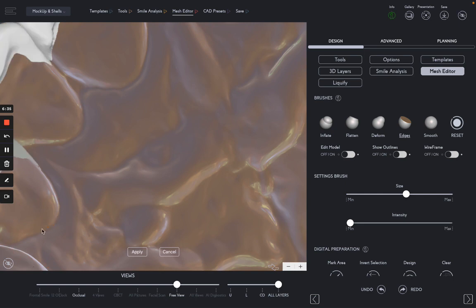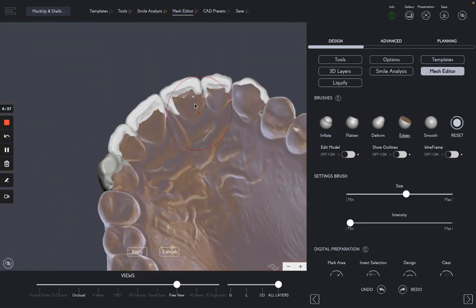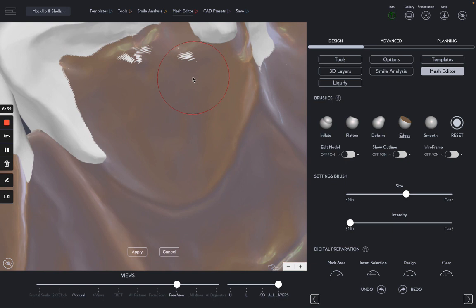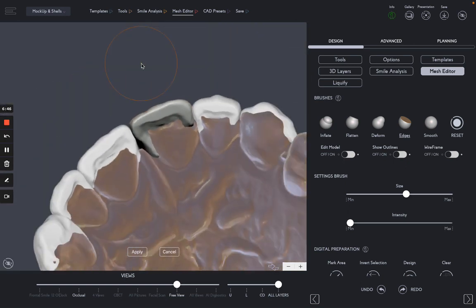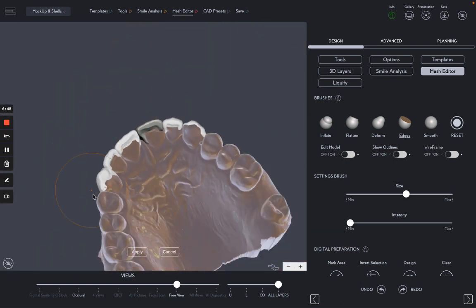All right, so now that it's nice and clean, actually there's a little bit here as well. Let me select the tooth first, and now, okay. All right, so now that it's nice and clean, you will hit apply, okay? This button is right over here. If you don't hit apply, everything will be canceled. So this is super important, okay? So hit apply, which is right over here.